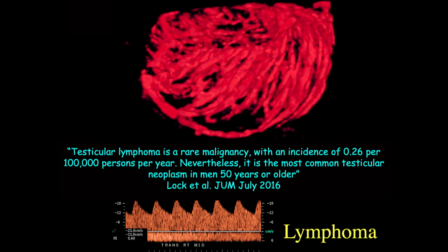So I always thought it was really rare, but look at all the data you have. If a 70-year-old comes in, particularly if they give you a history of lymphoma or leukemia, because it's hard for the chemotherapy to get inside the testicles, that's the number one spot for recurrence right there. They're often very, very vascular. Look at this pretty image Mike gave us.